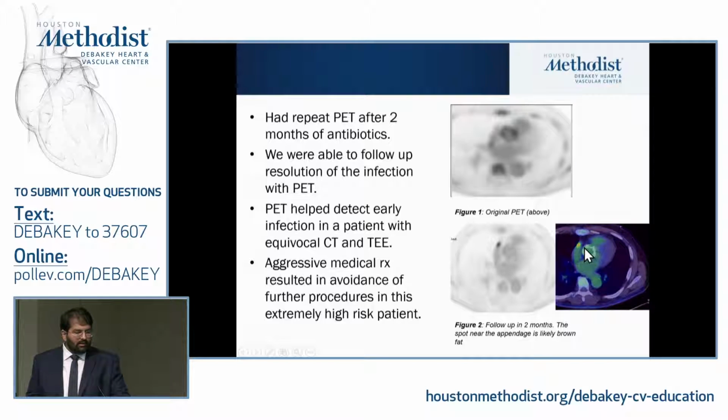But this and the other common artifact we see is, after surgery or any kind of inflammatory process, there is uptake. And there's also uptake when surgeons use adhesive glue, surgical glue. There can be uptake. But this was nothing to worry about. We were overall very happy with how he had progressed.